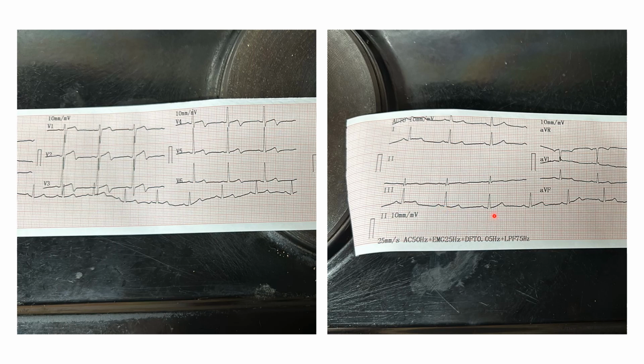Our PR interval was normal as well, and our QRSs were quite narrow, and we had a QRS following every P, and the bunches of P QRS were relatively regular. So we've actually got a patient who's got a sinus rhythm. There's nothing much from the rhythm point of view, and if we look at the rate as well, we've got a rate that's well within normal. It's about 70 somewhat. So we're looking at a patient who could possibly have an ischemia as well. And I think that's the most important thing to decide here, because does this patient have an ischemia or not?